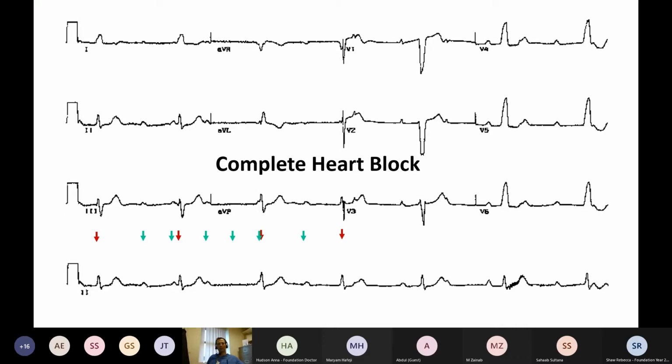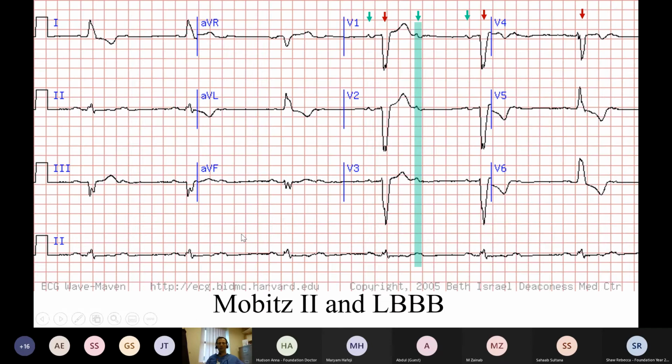If they have it on an ECG that you're doing in surgical pre-admissions or for another reason, and they're in 2-to-1 heart block like that, the previous one, I would want to admit that patient because I would be worried that if they're doing this all the time, you'd pick it up by random. They're probably in higher degrees of heart block at other times and are again at risk.